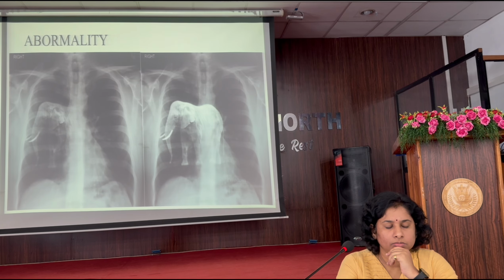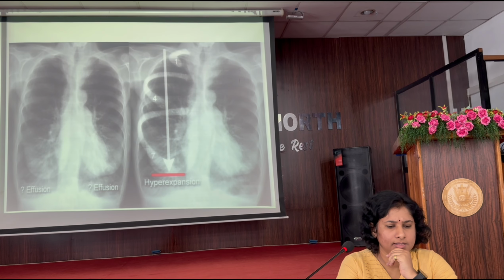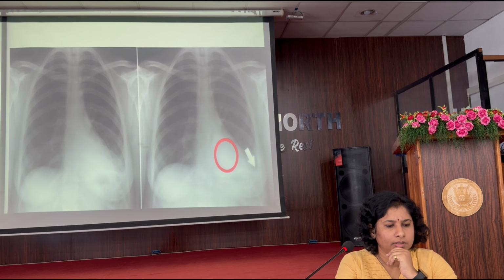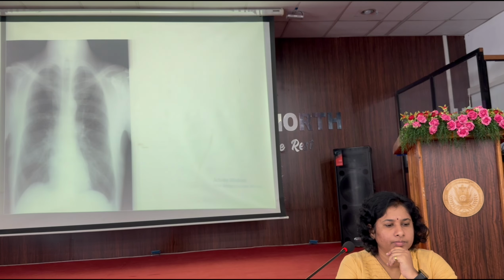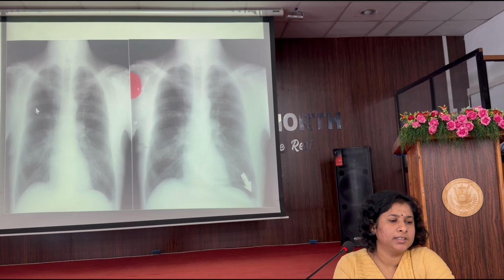So that is the fourth thing. And here, this is due to the metastasis. Again, don't miss the review areas, the lateral parts.